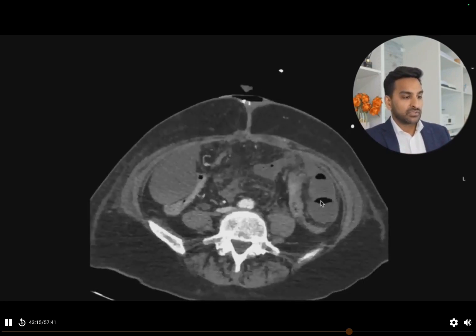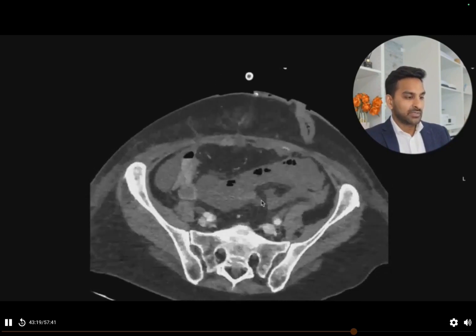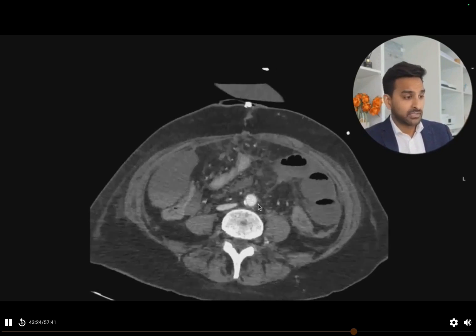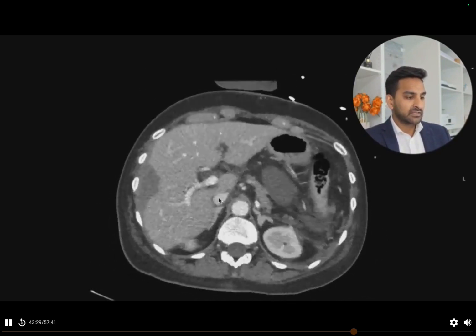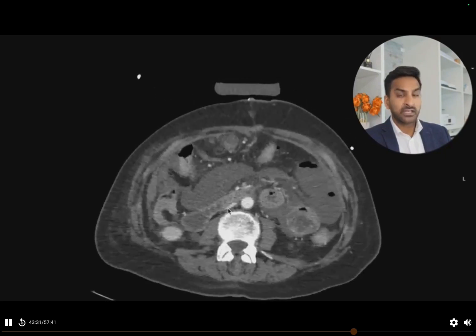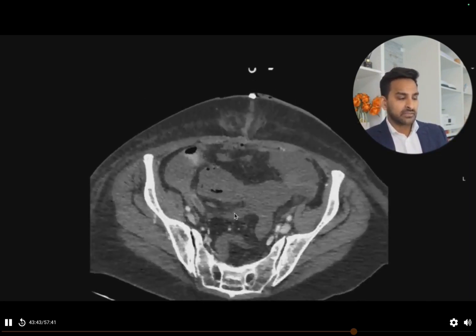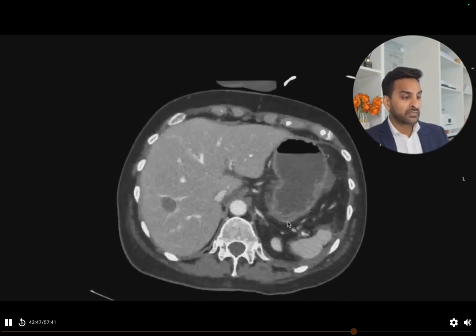And now it also looks like there's some ischemic bowel located within the lower abdomen and within the left abdomen as well. Okay, so this is clearly an emergency. We've got to let the clinical team know. But actually, if you look at the IVC, it looks like it's very, very flattened, almost pancake-like. So they have bled so much that they're actually looking like they could be hypovolemic. And actually, the ischemia could have happened because of the hypovolemia. Yeah, I mean, that's all within the realms of possibility. And there's quite a nice narrative for what we're seeing so far.